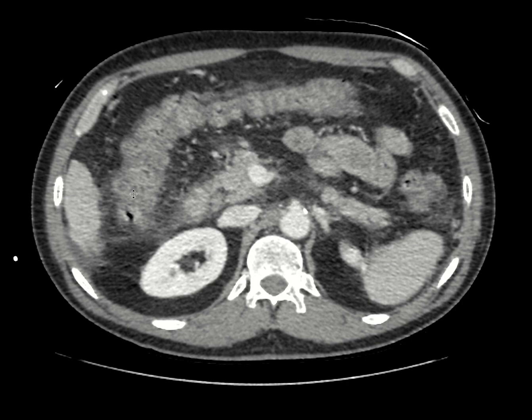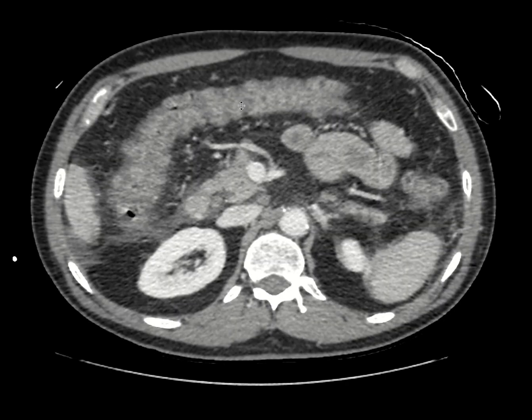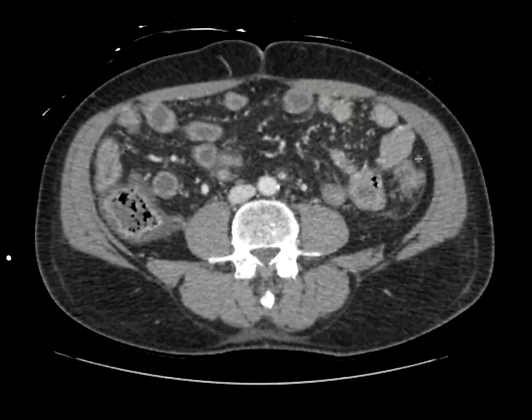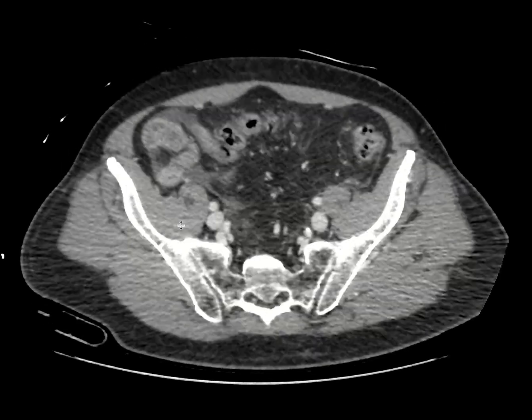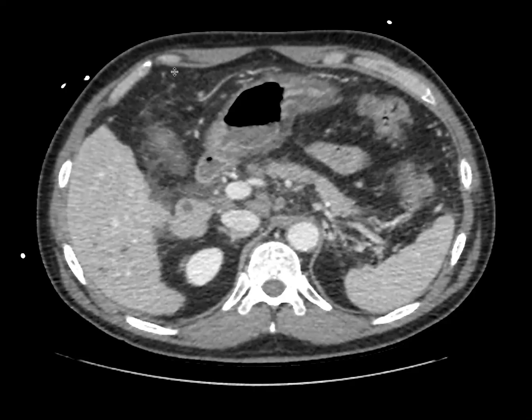You can see in this patient here, once you get to the hepatic flexure, the transverse colon looks normal, and so this is the right colon that's involved. The left colon looks uninvolved, and so this is a patient that ends up having portal colopathy in the setting of portal hypertension from cirrhosis.